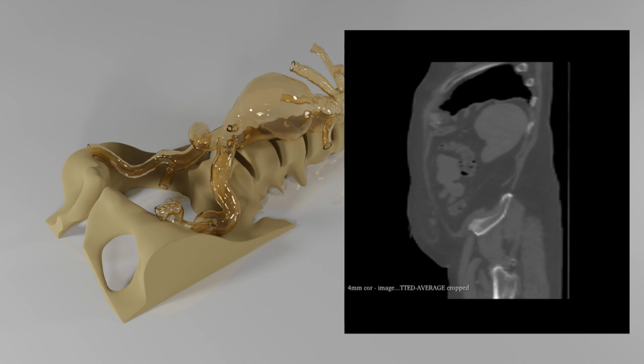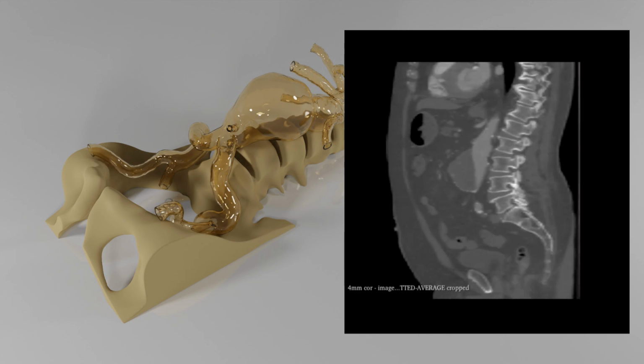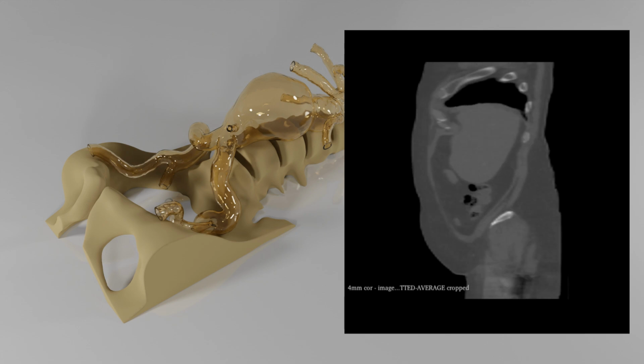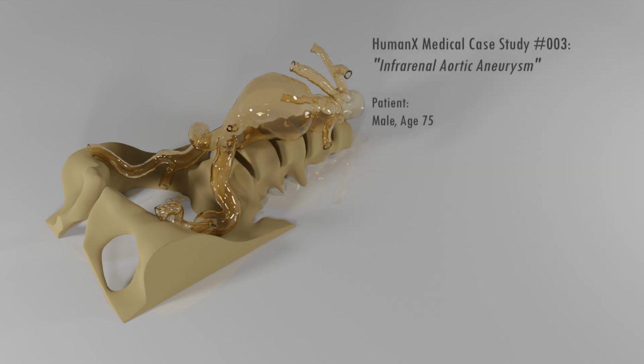The surgeon intends to use a procedure called Endovascular Aortic Aneurysm Repair, or EVAR. It is a minimally invasive procedure that uses only small incisions in the groin to access the vascular system. He then uses a catheter to place a stent graft inside the aneurysm. The stent graft acts as a new pipe to reline the aneurysm and prevent it from rupturing.